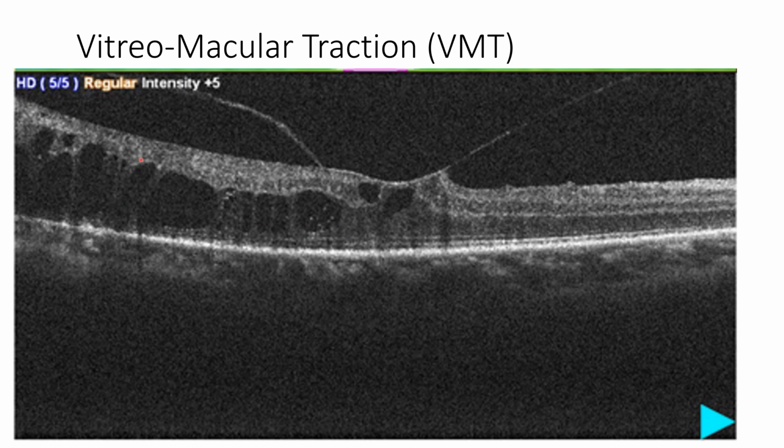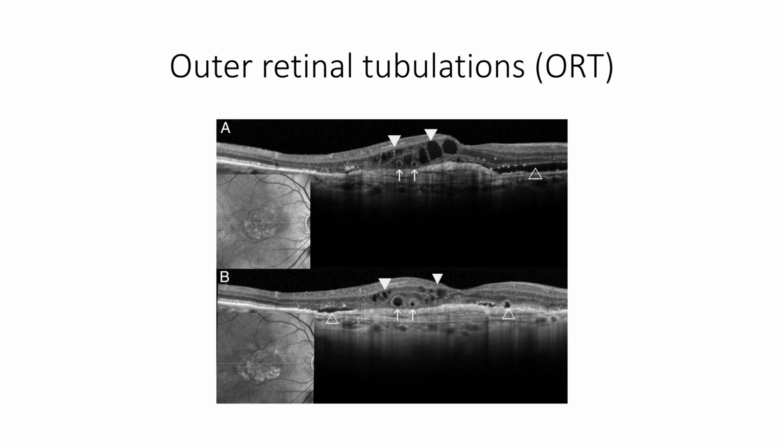So this is a condition which will require careful membrane removal and an ILM peel, although ILM peel will not be very safe for this condition, because this can actually cause an increase in the split of the tissue. This is one condition which we can see. This is a case of branch retinal vein occlusion.